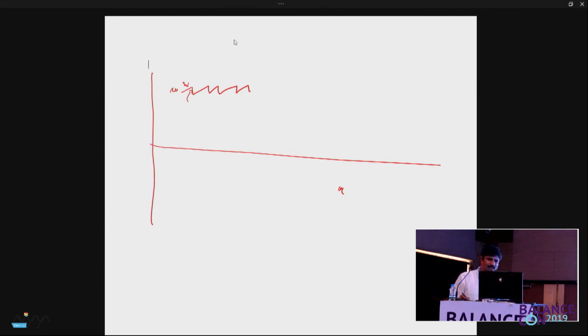Now, the eye was like this, and then here it means the eye has gone to the left side, because down part of the graph means left side. Now here also, what is the oscillation pattern you are seeing? At that zoom level it may not be very manifest, but you can make out that it is again left beating. So this is the direction fixed nystagmus. Then direction changing nystagmus after hyperventilation.